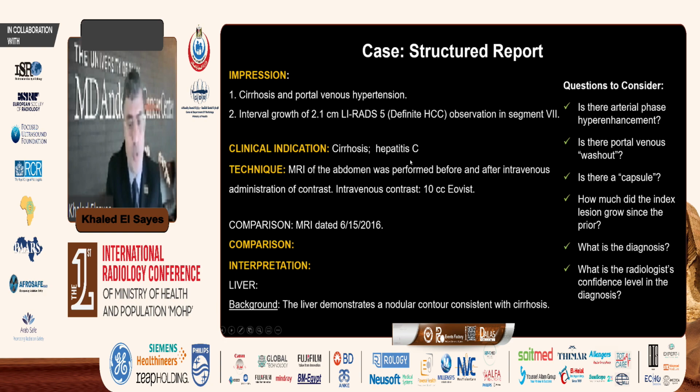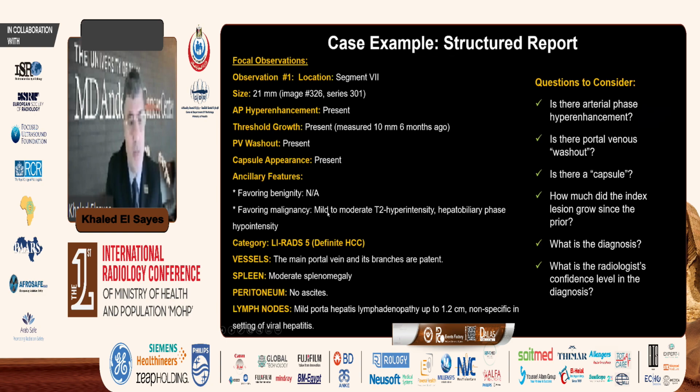This is very important, and we're going to go over this, including the technique. It's also very important, and prior study. And then you are mentioning here all major features after you indicate the presence of focal observation and localize it and measure it, and the size here is one of the major features as well. So you are mentioning all of this, and in addition to this, you are mentioning also ancillary features that can help you in the diagnosis.